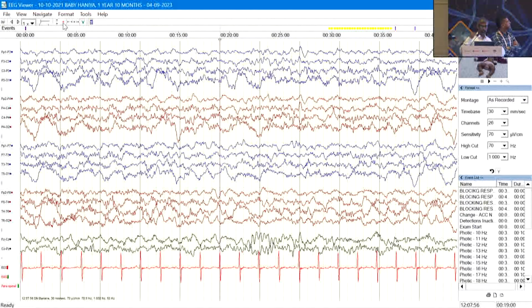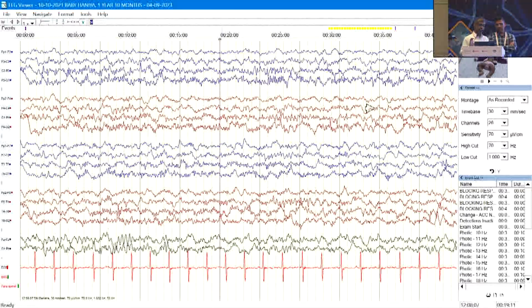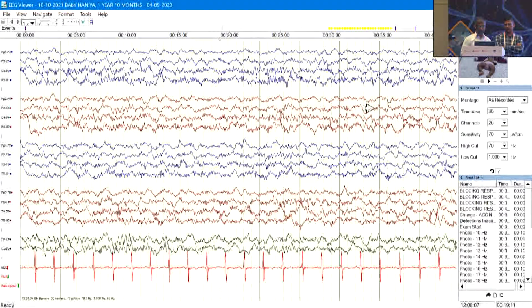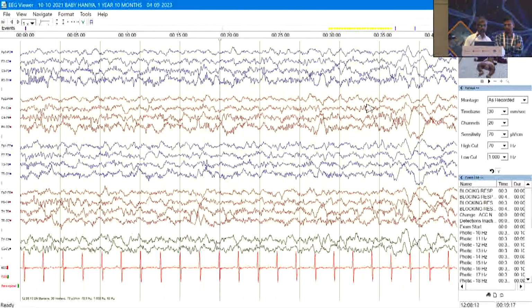Now you can see they are all higher amplitude activity. In 70 it appears very tall, and you have some cone waves, you have posterior sharp delta activity, and it's a very fast rhythm, more beta and alpha frequency activity most of the times. So this is sleep EEG, but it's a mixed frequency, beta predominance with the theta and delta activity coming in, right?